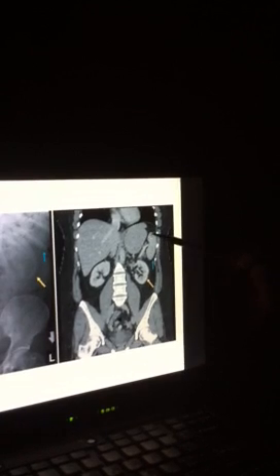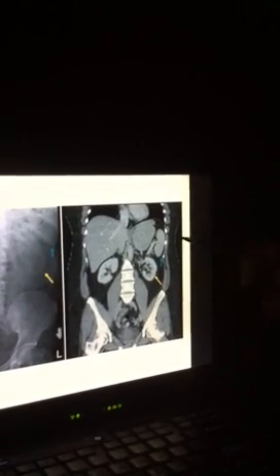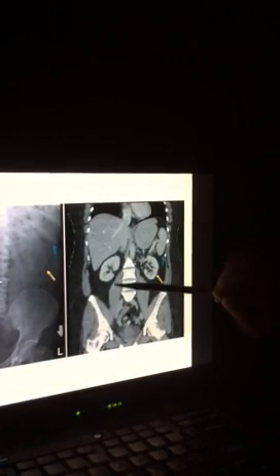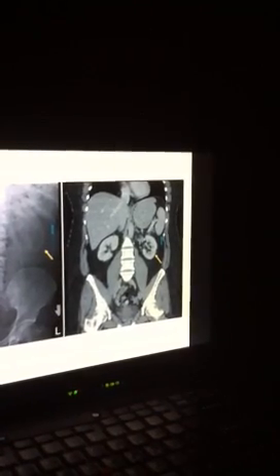This right here. Yep, and you can see some of the vessels. This right here is the aorta. Kidney. You got this right here. So is psoas major, yep. What about this one? Iliacus. Any questions about this one?